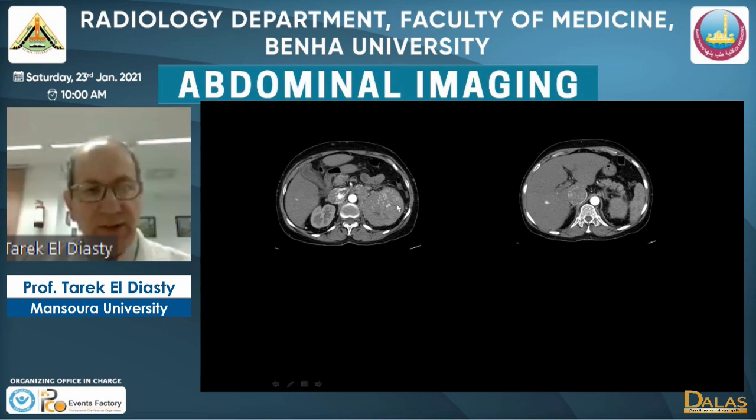The kidney is enlarged with abnormal vasculature here and abnormal vasculature in the inferior vena cava. So this mass is not well defined like the usual renal cell carcinoma, and shows the infiltrative pattern with vena caval thrombus. This is also in the late arterial phase. We can see here enhancement at the wall of the inferior vena cava.